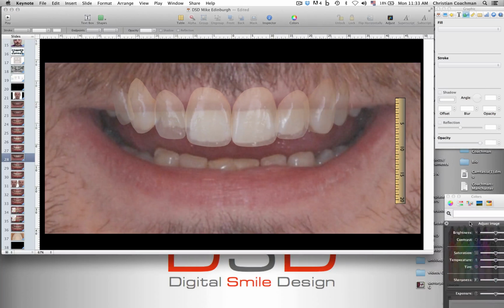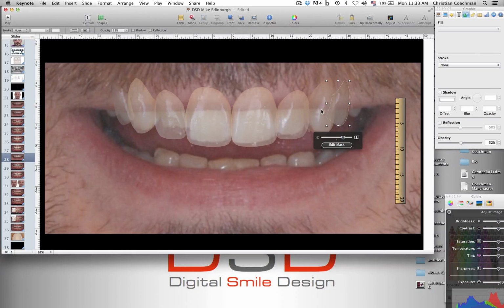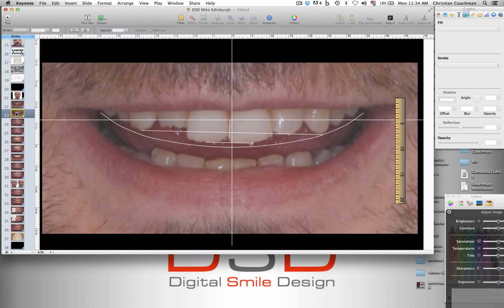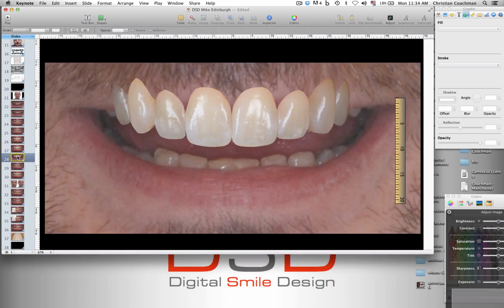Now the last step is to bring the lip in. But first, I don't need this translucent anymore. I need the lip now. So the lip. So you selected the back photo, that photo. Okay. You come from here and you go back to here. If everything is overlapped, the images will overlap perfectly.